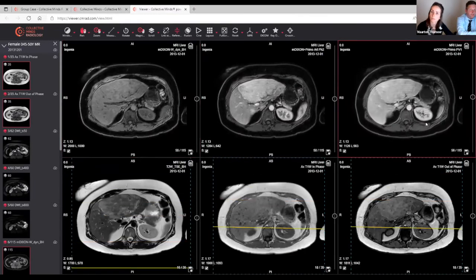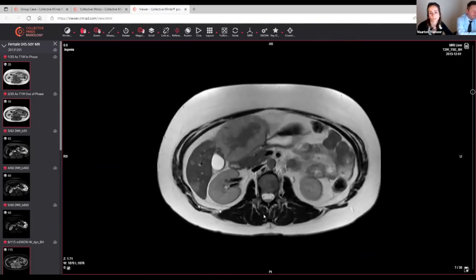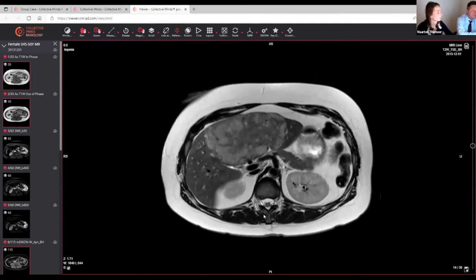Well, the fact is, if you have a cholangiocarcinoma, maybe mostly the center of the lesion is slightly hyperintense and enhances also in the late phase due to scar tissue. And that's different from stasis as it is in this case. So here the vessels are filled with contrast in the late phase. So there's more peripheral and the lesion is very homogeneous. Another thing, as I said before, if you have a cholangiocarcinoma, it's never iso-intense to the surrounding. It's always very heterogeneous. So the differential is quite easy to make normally.